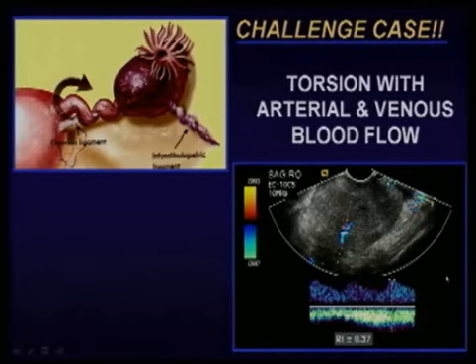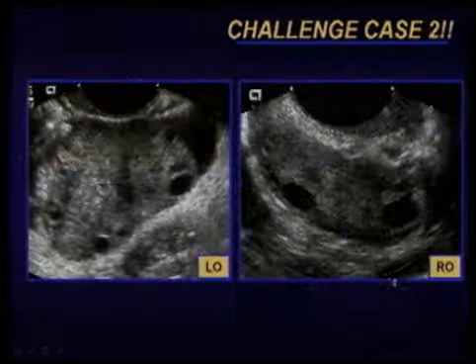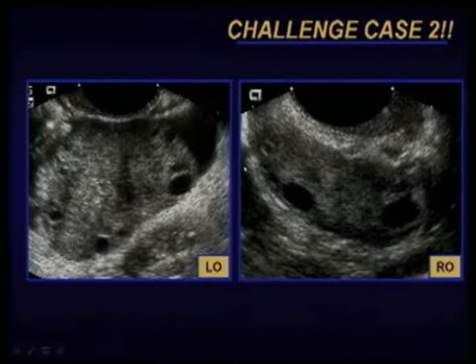And I urged the surgeon to bring the patient to the OR sooner rather than later, because if the torsion got any tighter, she might cut off the blood supply to that ovary and it might necrose. And the surgeon was so gratified when he went to the OR and saw that this was a viable ovary. That's very important. Obviously, by the time it's necrotic and dead, there's nothing you can do but take it out.